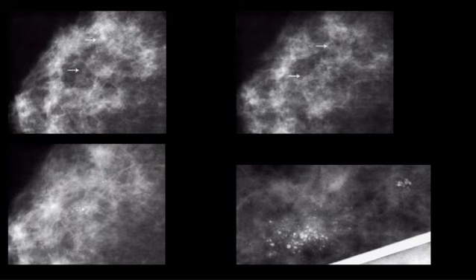Okay, the calcifications are pleomorphic, variable density, and a few linear forms. You can see the same thing with a spot compression magnification view. It's much more. It is different shapes, different densities. It's localized. That's a suspicious kind of calcification. It's increasing in number, increasing in density, increasing in shape, let's say in pleomorphism, indicating a BIRADS 4C to BIRADS 5 kind of calcification, something like that. Biopsy is indicated, and it was a high nuclear grade ductal carcinoma in situ. Okay.